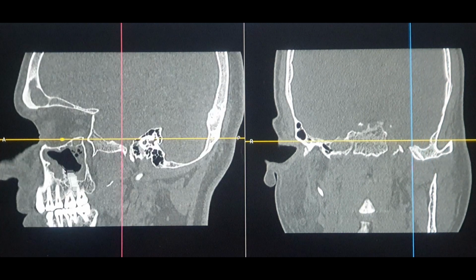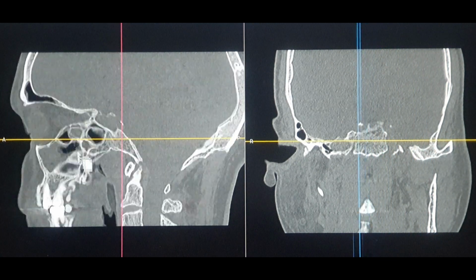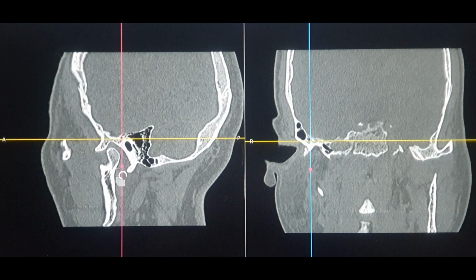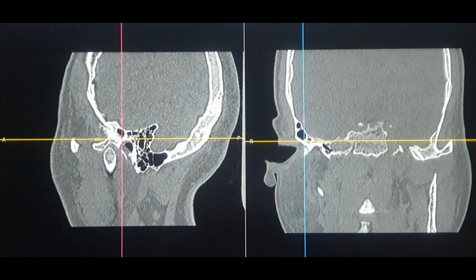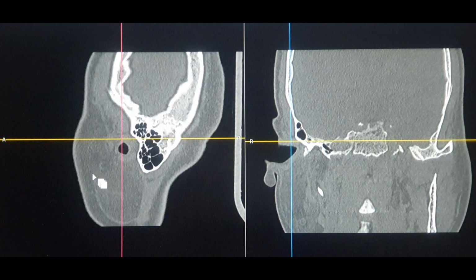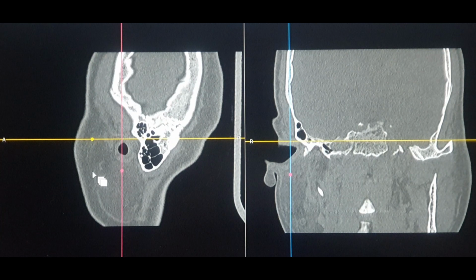So that suggests that this is definitely the left side of the patient. The same thing, if I go to the extreme right side of the patient, what I will get over here is first the temporal bone. To make it more clear, this is the mastoid region, and so far I cannot see the auricle up to here, okay?